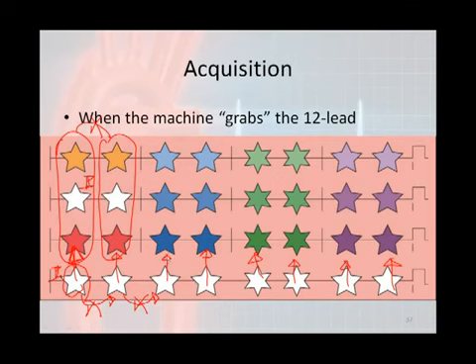The reason that we do this is because if you need to interpret a rhythm and you have all kinds of ectopy or something else going on, you need to know what the underlying rhythm is. If you look at these stars over here, you might not know that this complex and this complex were premature or ectopic beats of some kind, because it is in a different lead.